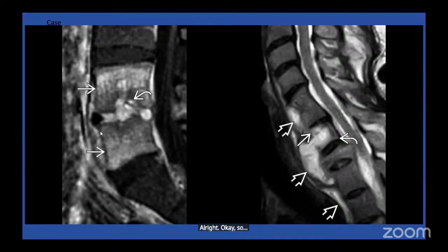Okay, so then I would start with. So in this image, we can see the vertebral body at, let me start counting. So this is a C-spine, yeah, and this is a lumbar spine, yeah. So 2, 3, 4, 5.